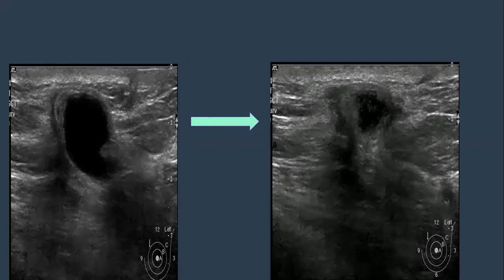So representing the residual mass, confirmed on ultrasound, the residual mass. Why is the residual mass regressing? Malignant mass is getting small. Chronic hematoma or seroma. Hematoma, okay, or seroma. Yes. Okay. Hematoma or seroma. Right. Okay. And the calcifications.